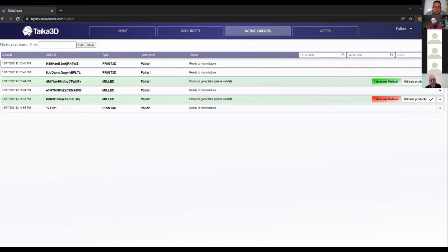So you could, for example, say, okay, I can assign these to milling machine 1 or 2, or I can send these 3D printed jobs to the printing bucket, which is their buffer, where the printing guys then get a flag that there's a new job here. Figure out which job you're going to nest it in.